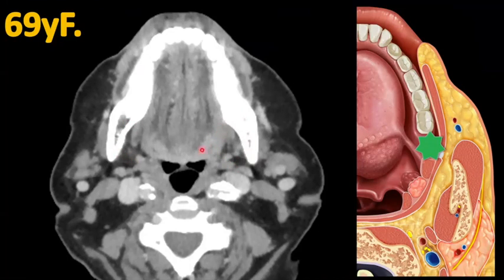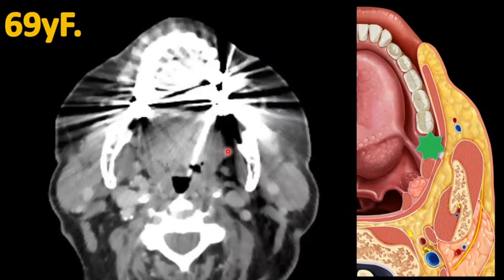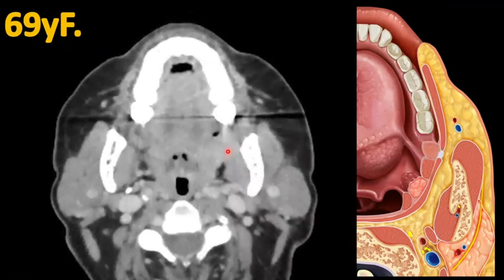So when you get a request form that says oral cavity tumor or oral squamous cell carcinoma, you can be forgiven for not seeing this subtle asymmetry. And then, of course, you have the benefit of fabulous amalgam, once again, making life really difficult. And it's no wonder that these tumors are readily missed. But as we go northwards, and this is one of the things to think about with RMT tumors, they have a tendency to grow northwards as well as anteriorly and medially. It is growing upwards. But notice this interesting feature.